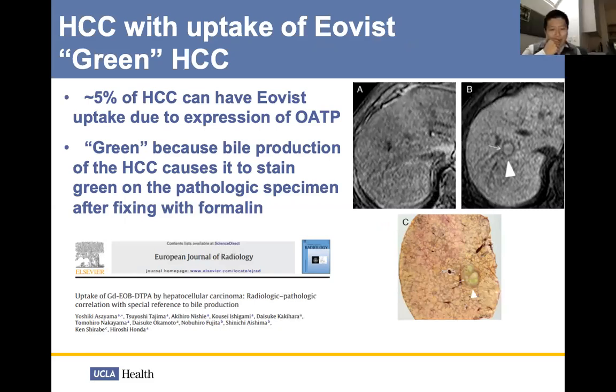I'm sure there probably are, but I just haven't seen that weird. I've had a few cases of that, especially when they get really big, they start looking really weird. And you basically can't tell the difference unless you biopsy it. Biopsying an FNH can be challenging because it's disorganized liver tissue, so you really need to get a lot of big cores. Otherwise, they'll say, these are hepatocytes. With something that looks like that, it's not hard to talk a surgeon into taking it out to know what it really is.